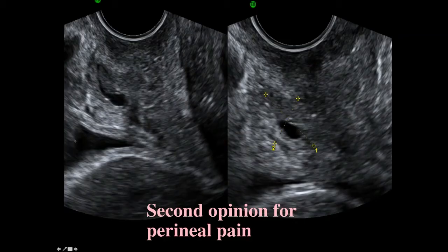Now here's another urethral diverticulum. This one was sent to me for a second opinion for perineal pain. Nobody knew what this was, and this was a cyst, a little cystic area that is anterior to the urethra. You can't see the urethra in this particular view. What you can see here is the bladder, which is collapsed, and you can see the front of the very anteverted uterus. Now here we don't see the connection with the urethra, but we still know it's a urethral diverticulum because that's what occurs there. And it's a pretty limited differential diagnosis there.